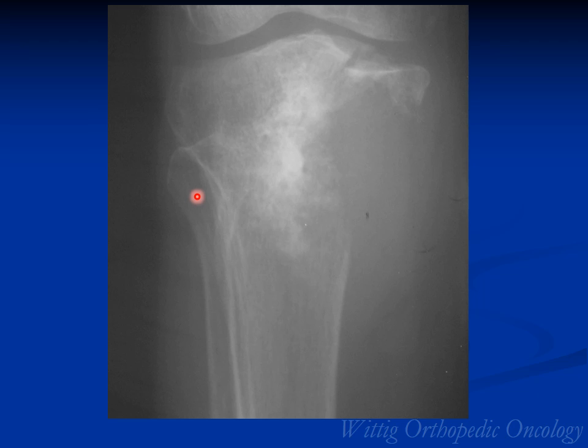This is a biphasic tumor. This is a dedifferentiated chondrosarcoma. You can see here where there is a low-grade appearing cartilage tumor juxtaposed to a more aggressive lytic tumor. This more aggressive lytic tumor is a high-grade spindle cell sarcoma, namely either an MFH, an osteosarcoma, or a fibrosarcoma.